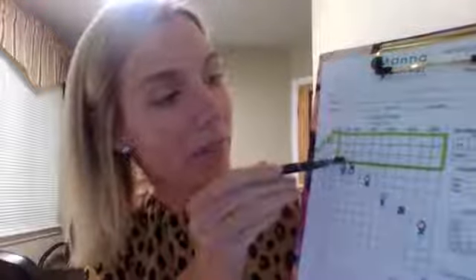So what does this all mean? How can we use this information? So based on the test, this tells us how much volume we need at all of these pitches. Obviously, you're not going to have the same level of volume all the way across the board. So we want to make sure that that hearing aid is fine-tuned exactly to your hearing test. So you can see in this example, this patient is going to need a little bit of volume over here and a lot more volume over here in these high pitches in order to hear in that normal range. So that's essentially how we use this information to program your hearing aids.